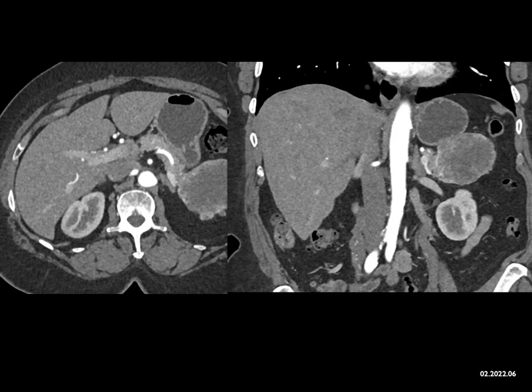But in fact, this lesion was a serous cystadenoma. I'm showing it to you, and I'm going to give you credit for almost every answer, but this shows you the difficulty and overlap between lesions. Serous cystadenomas we like to think about purely cystic, with thin septations, maybe dystrophic calcification. We don't see any of those findings here. So it's really a tough call.